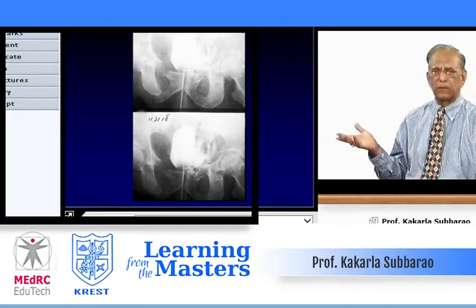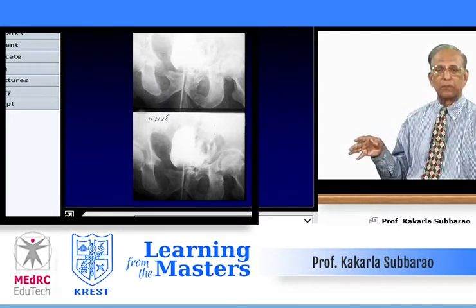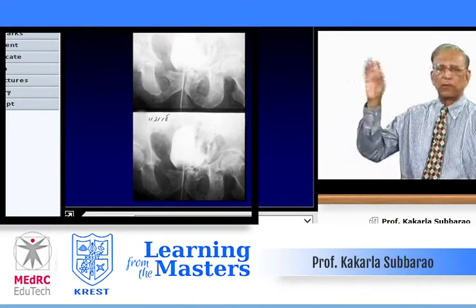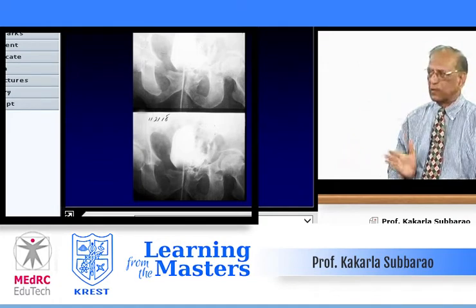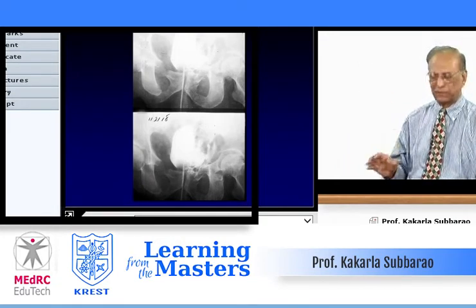How can you say that it is not an intraperitoneal rupture, but a retroperitoneal rupture? Because an intraperitoneal rupture goes freely into the peritoneal cavity and outlines the walls of the intestine, whereas here it goes into the intermuscular planes and is linear.